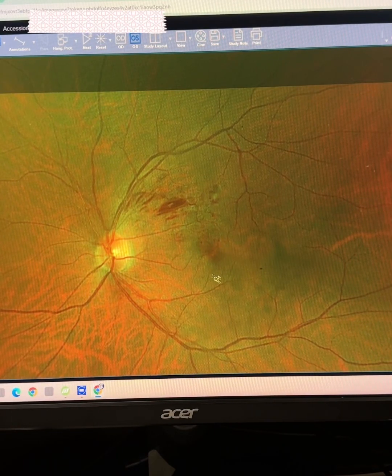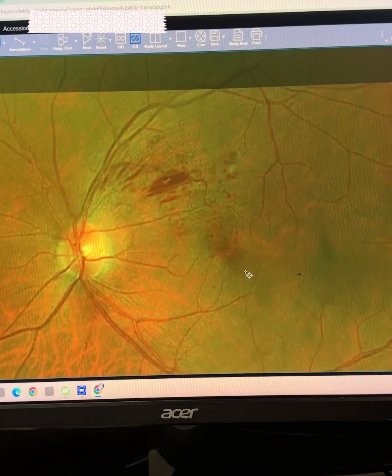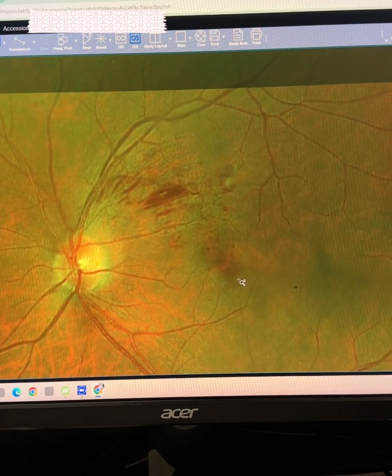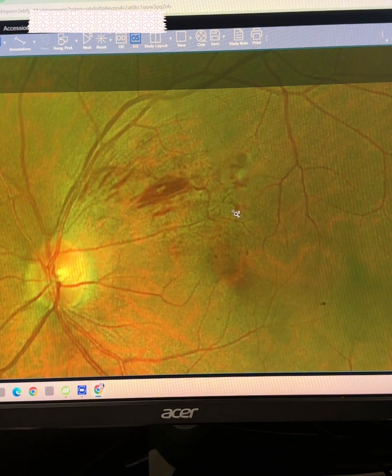59-year-old male who presented for new glasses, and you look at the fundus and you see this. Anyone wants to try the diagnosis here? So what do we have before you jump into diagnosis? What do you have? You have an area of, what does it look like to be here? Aha. So we have bleeding on the retina.